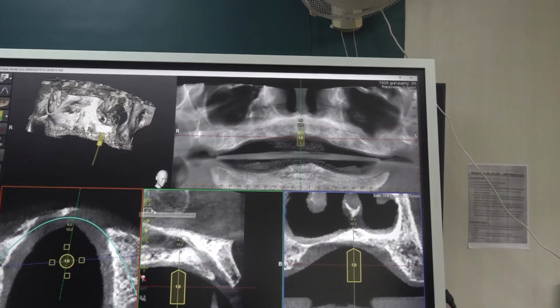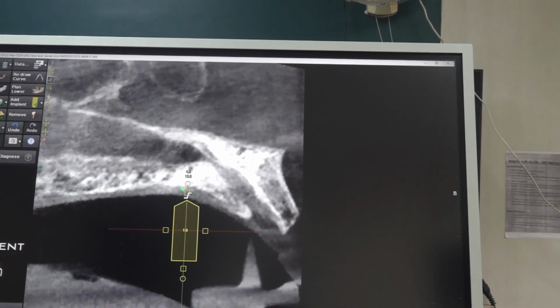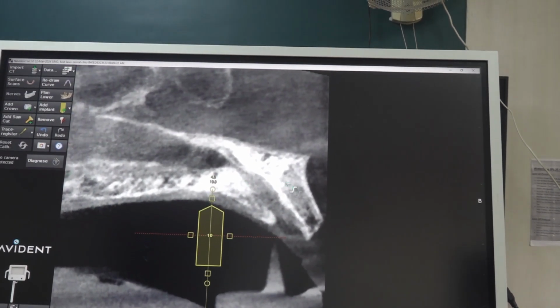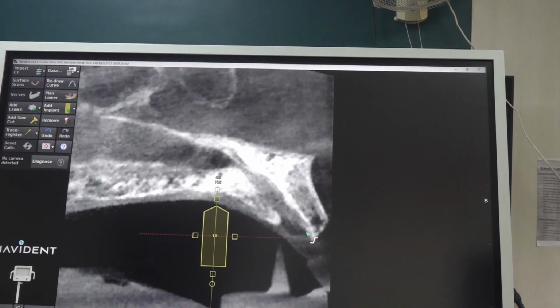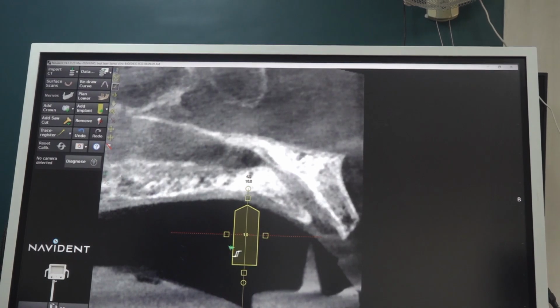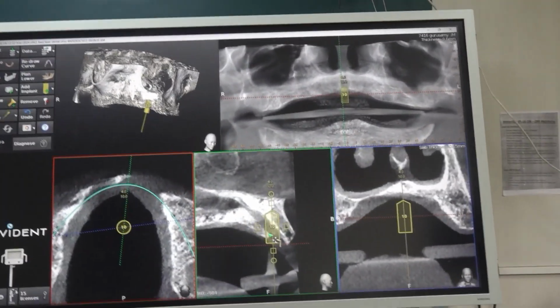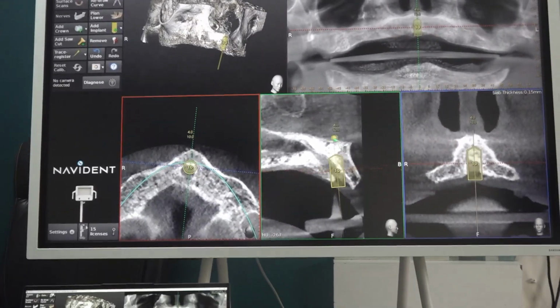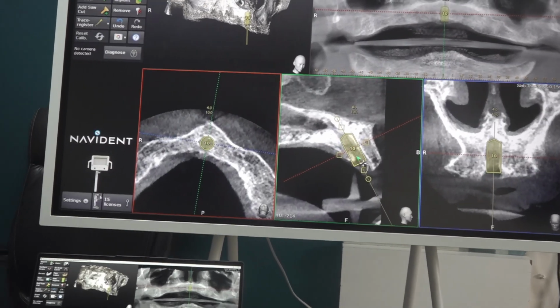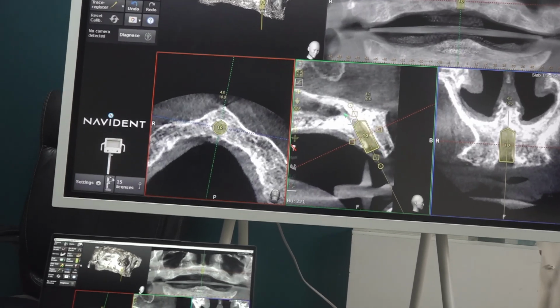So what is this canal shape? What is the canal shape? Funnel. This is cylindrical. Okay. Funnel means in the crest it will be very wide. Okay. So both the walls are parallel. No? So mostly it is cylindrical. You don't have to be worried about this thing. Okay, whether it is funnel, so there it will be always narrow. At the start it will be always narrow. Yes.